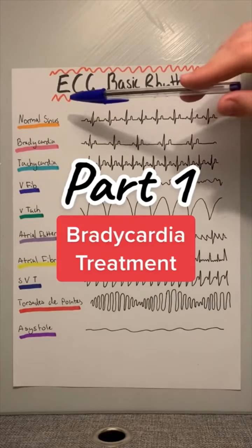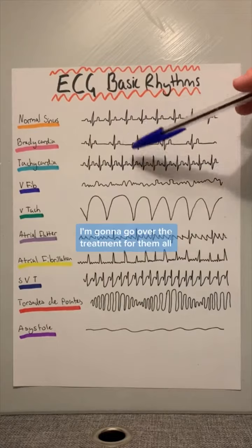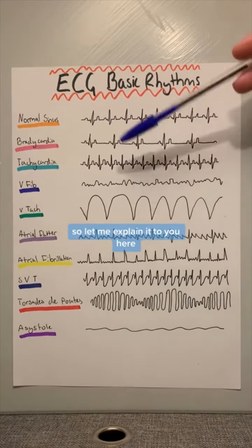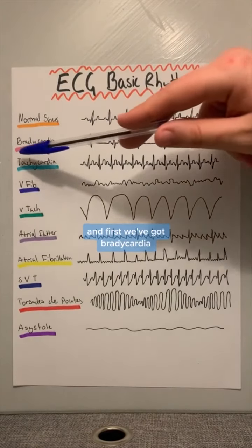Here's 10 ECG basic rhythms. I'm gonna go over the treatment for them all. You won't find a better video than this anywhere on the internet. So let me explain it to you. Here's sinus rhythms so you can compare all of these. And first we've got bradycardia.